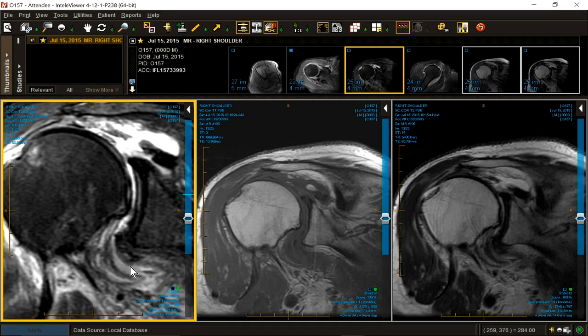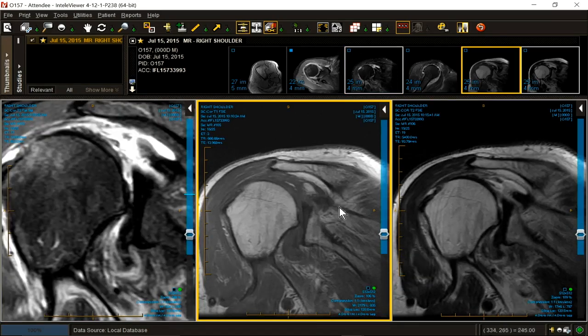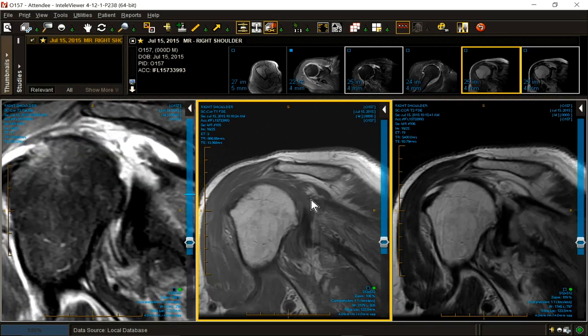It's come off and scarred to the upper portion of the humeral neck. So not only does she have rotator cuff pathology in every corner of Australia, including Broome, she's got a rupture of the IGHL from the inferior glenoid, known as a GAGL, a glenoid avulsion of the glenohumeral ligament. What's this bright area up here? Blood.